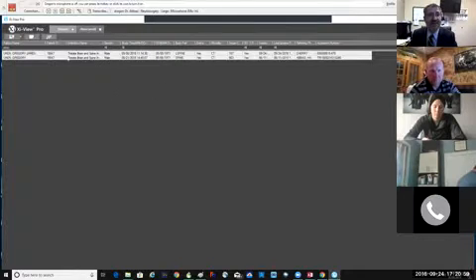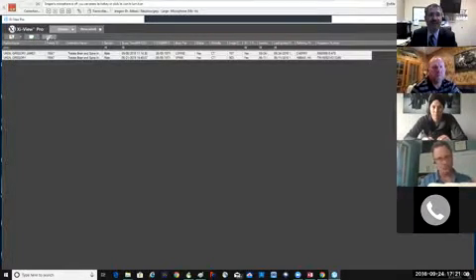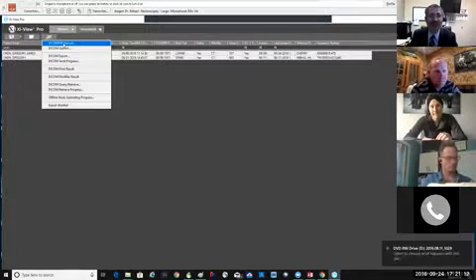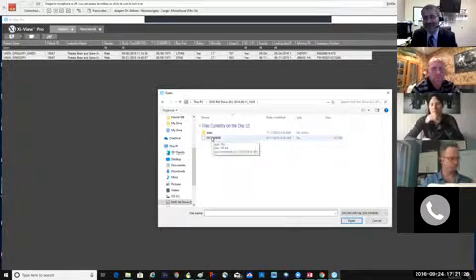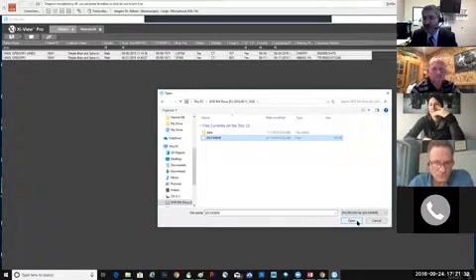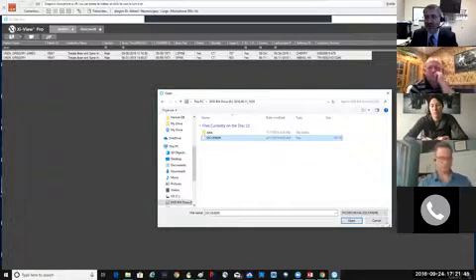Are you guys able to see that? Then you go on the top where there is a magnification glass. Right next to that, there is this sign with the files up and down, which is upload and download. Then you go to DICOM directory upload, DICOM dir upload. Then you go to this PC's DVD drive, and you choose DICOM dir. At that point, you just click open, and it uploads everything to 7Medical.